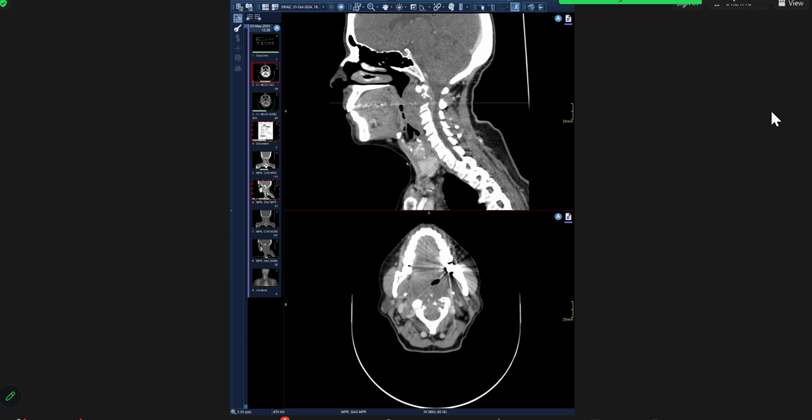You did the case well, but this was a chordoma. So for midline masses, always remember mets was okay, plasmacytoma was okay, and then remember the chordoma.